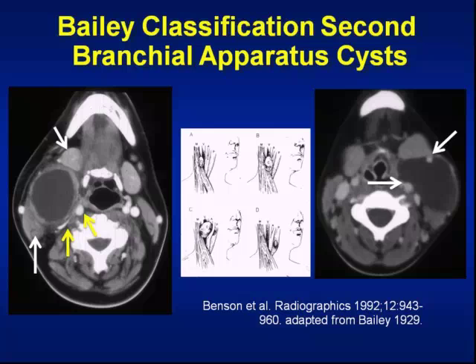in the classification of second branchial apparatus cysts. They can be parapharyngeal, or they can be occasionally like this one. So he's sitting in the correct place, doing what it's supposed to do to its neighbors, but look, it beaks in between the internal and the external carotid artery. So don't automatically say that's a lymphatic, because it might be crossing spaces or splaying arteries. This is a rare variant of the second branchial apparatus cyst.